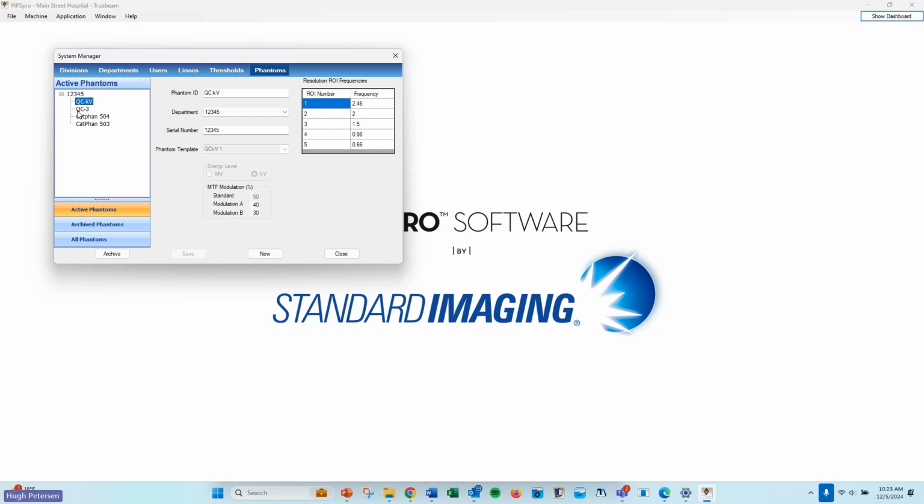The nice thing about our QC3, which is our MV-based phantom, and our QC kV, obviously our kV-based phantom, is that we have calibrated numbers from the factory specific to the frequencies put out by either Varian or Elekta. So they're calibrated to those specific systems. That's also unique to our phantoms: they are calibrated from the factory with specific ROIs. So that's quick information on our system manager.